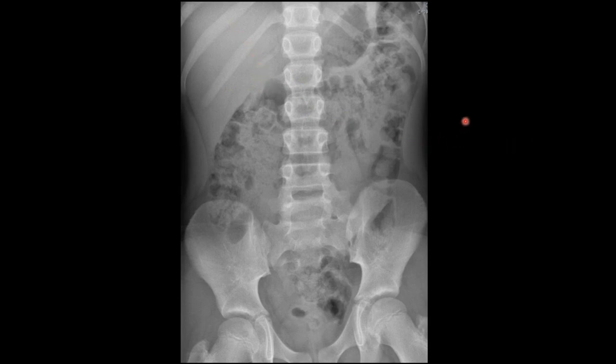Looking for ascites, sometimes it can be quite hard to distinguish organs anyway, but in ascites, there's a general greyness to the abdomen, fuzziness, because you've got that slight increased density of the fluid, which is masking everything. Again, we can see faintly the outer edge of some of these structures, so it doesn't look like there's any ascites here.